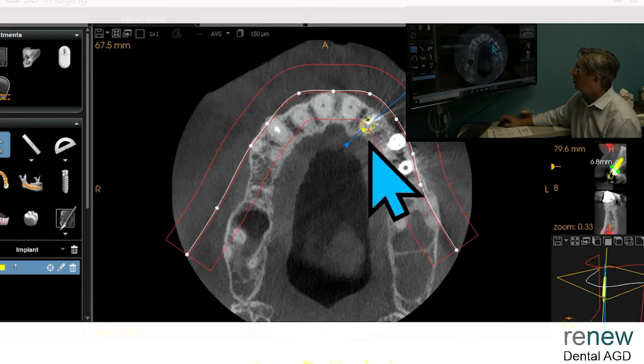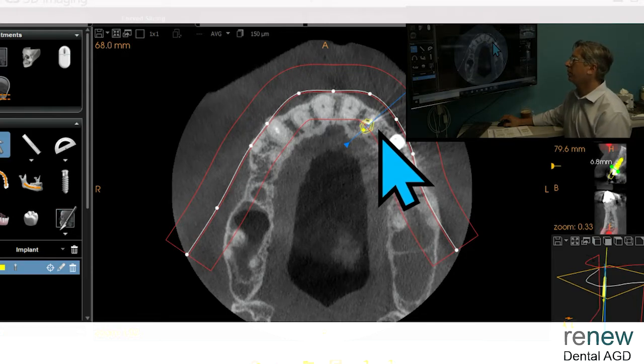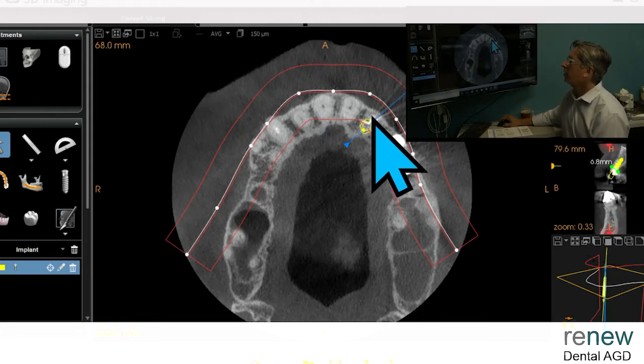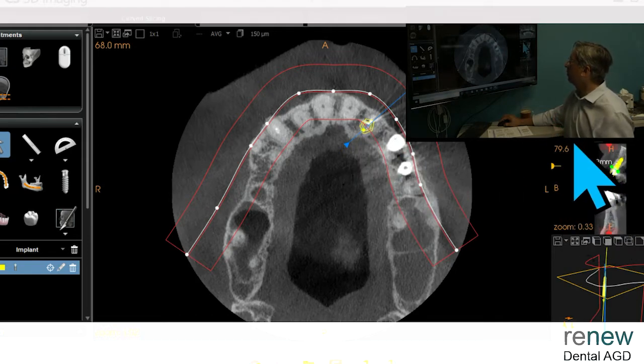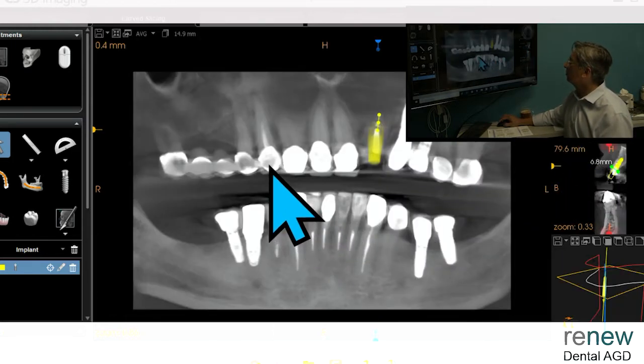Oh, there's the crack on the tooth, and we're down here. So you do have a bit of a gap to the facial bone, so that's good. You're going to have to maintain that, so if you put a little graft material or new bone in there, that's fine. This would be successful. You might have a little trouble with the papilla, but if this sinks down far enough and you have the right type of implant here in the anterior, you'll definitely be successful.